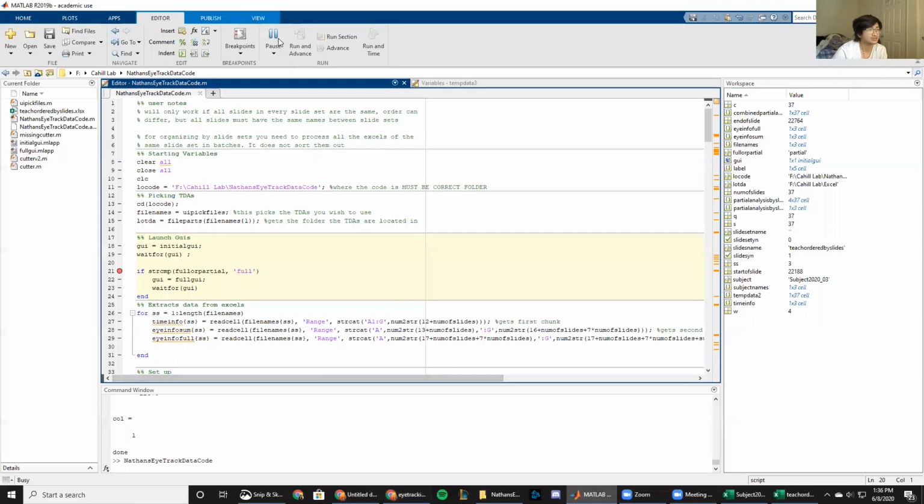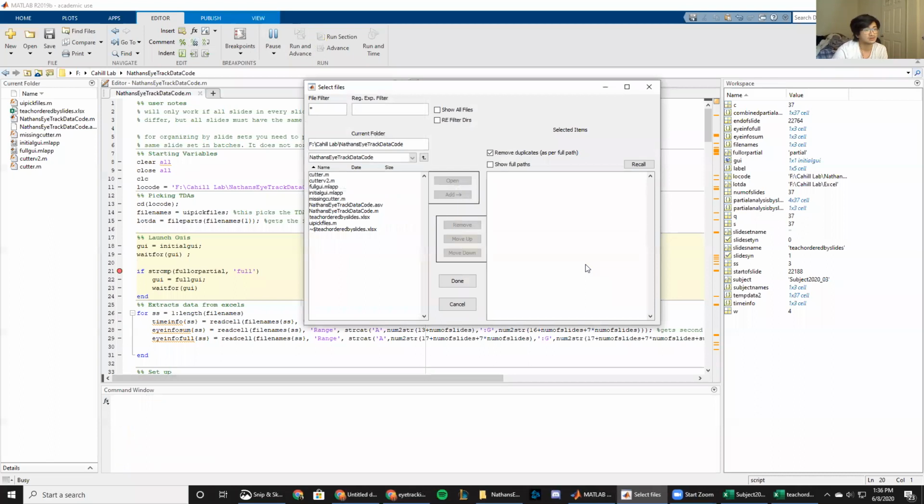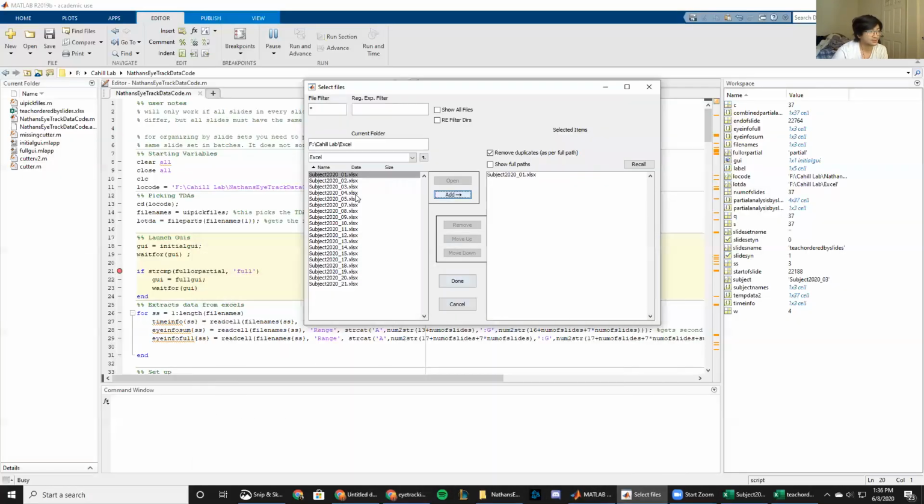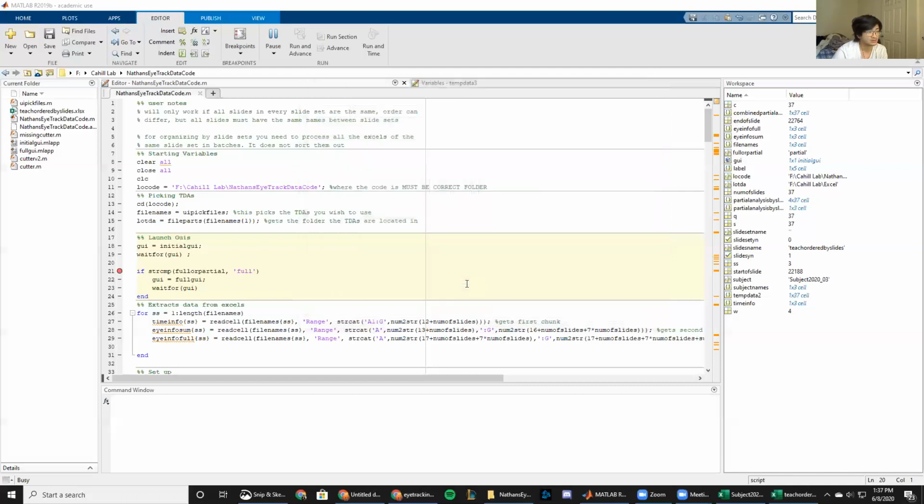We'll click run. And we will select 1, 5, and 9. Done.